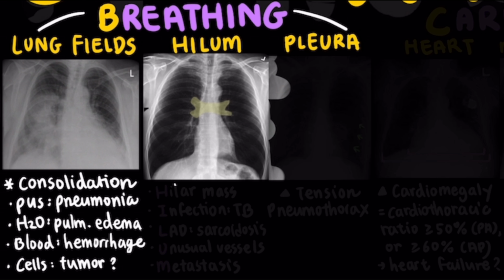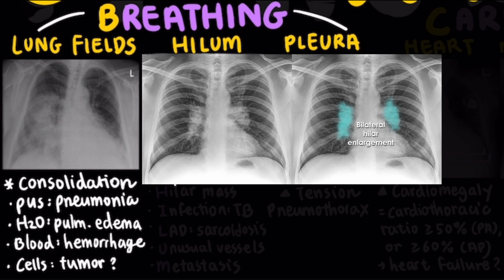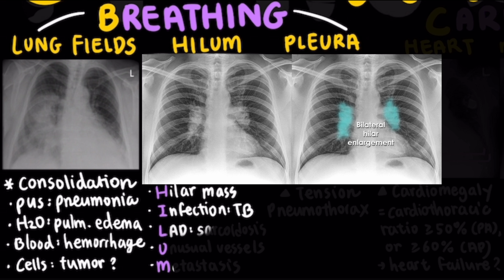But if the hilum looks abnormal or enlarged, we can use the mnemonic HILUM to remember the common causes. H stands for hilar mass. This could be a lung tumor like bronchogenic carcinoma or a benign growth. I stands for infections such as tuberculosis, which can cause reactive enlargement of hilar nodes. L stands for lymphadenopathy, abbreviated as LAD, seen in sarcoidosis and lymphoma.